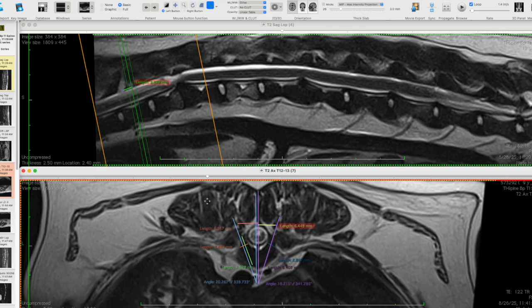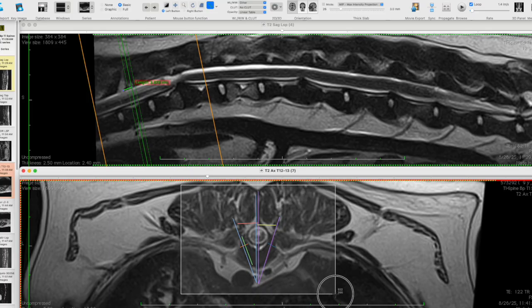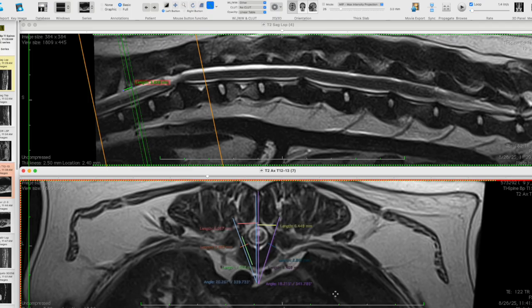So here I'm going to hit Shift, Command, and they go away. Now if I hit the 4 button, I can get my cursor up. So Shift, Command, 4. Here's my cursor to make my screenshot, but that doesn't do me a lot of good if all those measurements are gone. So there is a workaround to this. I'm going to show you how to do it. It can be a bit fiddly, but hopefully this will help you get around the situation.